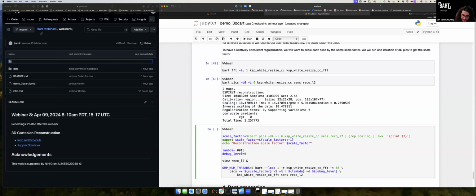You can see here, sorry, I'm going to change this to RQ.